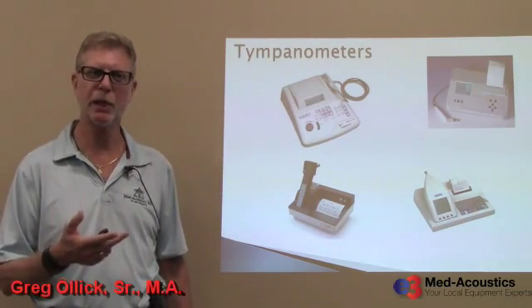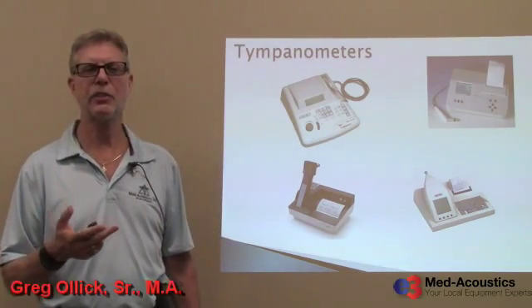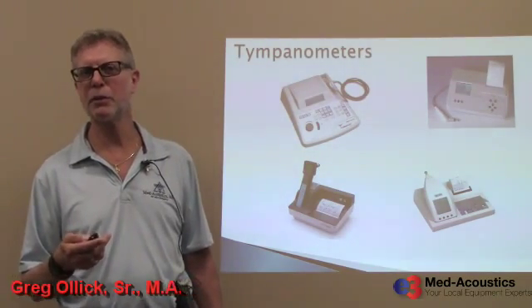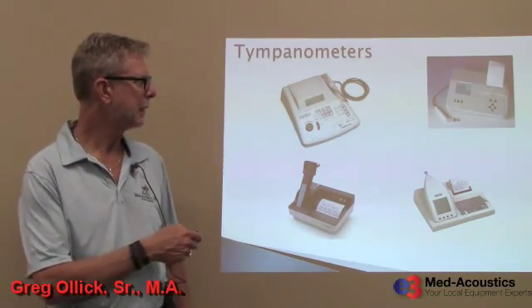You can print out tympanograms, acoustic reflex thresholds, as well as audiograms. And it's available also with an option for high-frequency tympanometry.